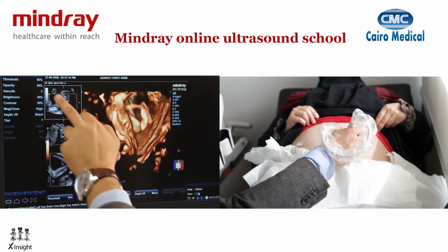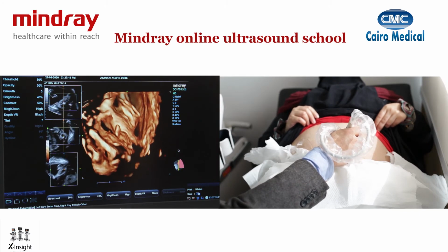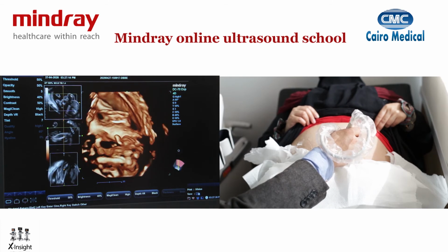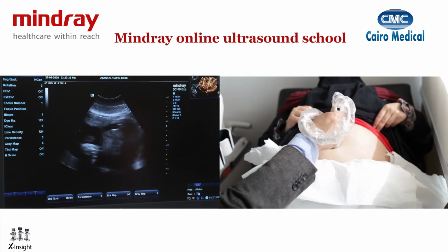You can actually see it here. You can actually move around it. So I can get it to sweep up, sweep down, this way, that way. I can rotate it from any direction I want. And you can actually see the gender quite clearly. Okay, so that's one point. Let's actually do some surface rendering on other structures.